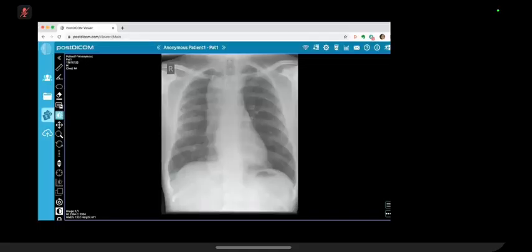Okay, so this is a frontal chest radiograph of an adult male patient showing long, linear, well-defined opacity on the right side of the mediastinum, extending below the hemidiaphragm and up to the neck. This pattern is in keeping with dilated esophagus given the complaint of the patient.